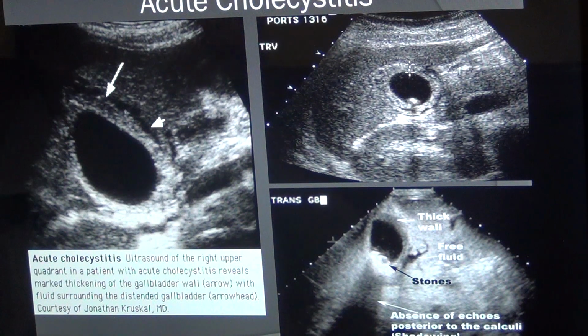As a result, the gallbladder wall gets gangrenous changes. That is very dangerous. When there are gangrenous changes in the gallbladder wall, anytime the gallbladder can rupture. Keep that in mind. At that time, the gallbladder will be distended. We call it gallbladder hydrops.